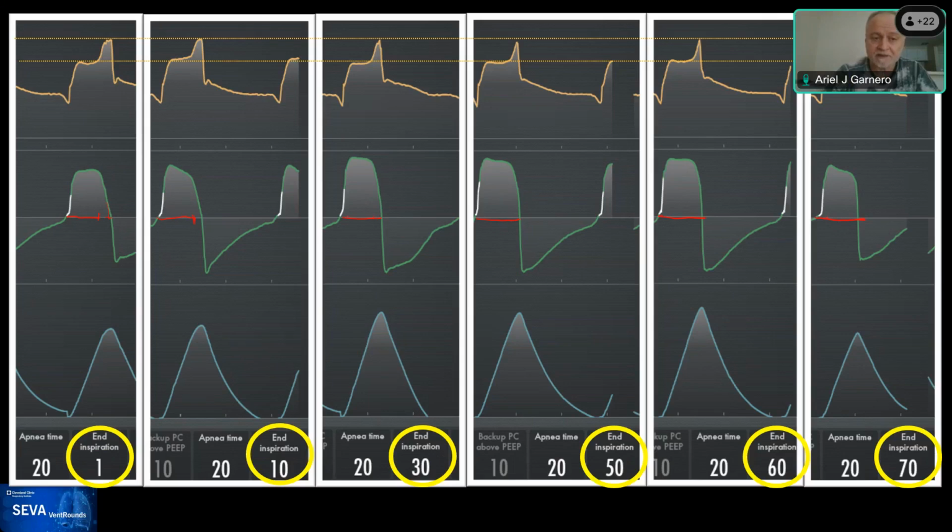Yeah, that's why the plateau pressure is going to be different on every breath when you have a spontaneous breath. And you can't even get it on some ventilators. I think you can do it on the Servo. That's why, sorry, those spikes to me don't mean that there is Pmus.